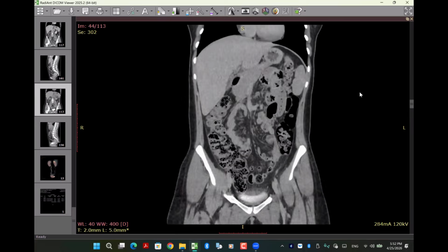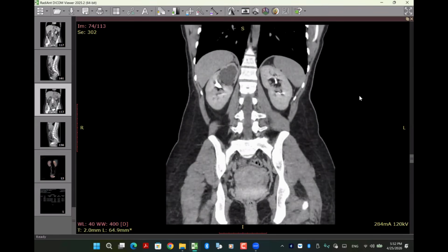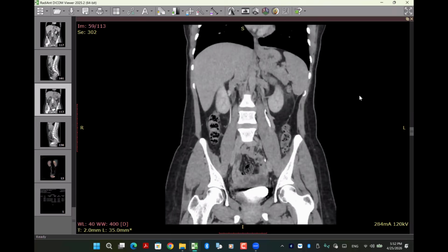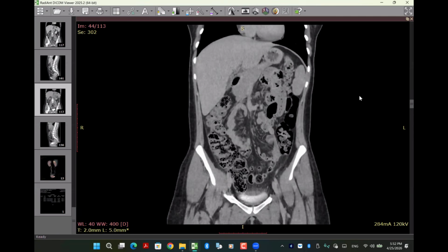Excellent. Yes, it is. So which rule or law are you following? Yeah, the lower moiety leads to reflux, and the upper moiety leads to the ectopic ureter. Exactly. Can you please give me the control? Yes, that is actually a classic presentation of the Weigert-Meyer law.